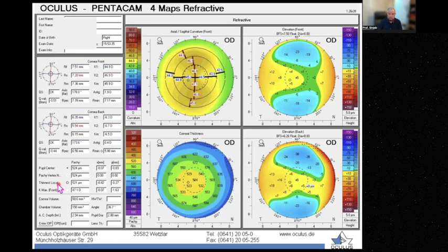Some populations, like North Africa, have thin corneas. For example, they take 470 as if our corneas were 530. That's why they do, for example, the PRK even for people having 450. But I don't agree with this, because we always have to stay on the safe side.